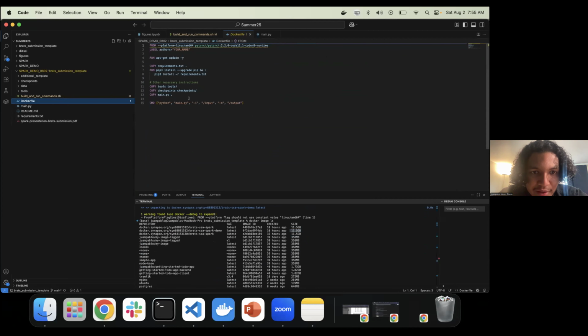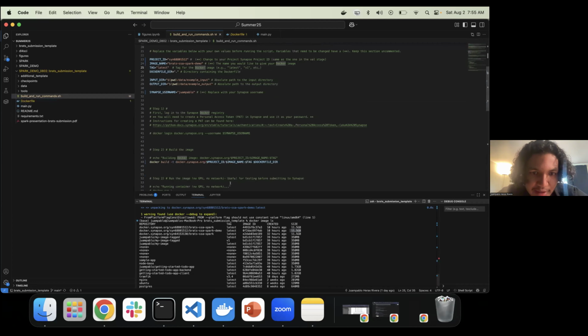If you change the things on this end, the Docker file will be faster to rebuild. So if you're making a slight modification on the bottom, the Docker file will make sure that it doesn't re-download all of these previously done operations, which is a really useful feature.